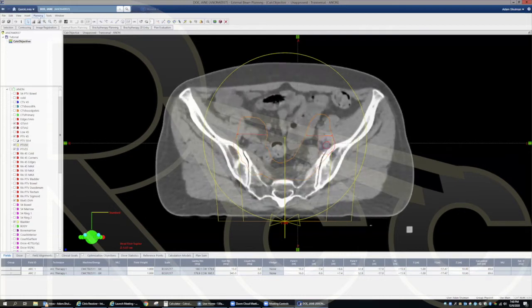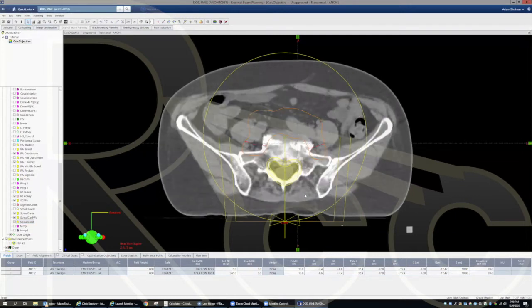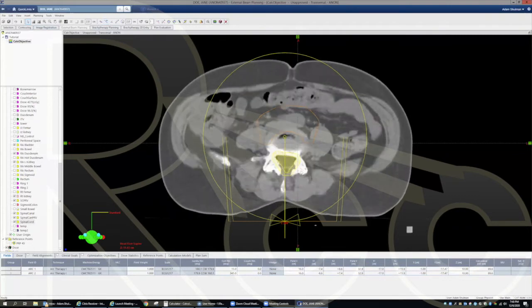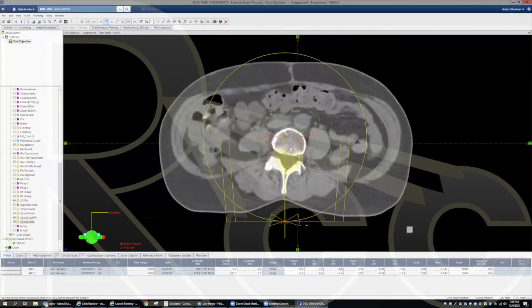And for just one more question for the cord, do you do PRVs? Good question. Yeah, so in this case, I think it was a 5 millimeter PRV. Yeah, it looks like a 5. Measure real quickly.